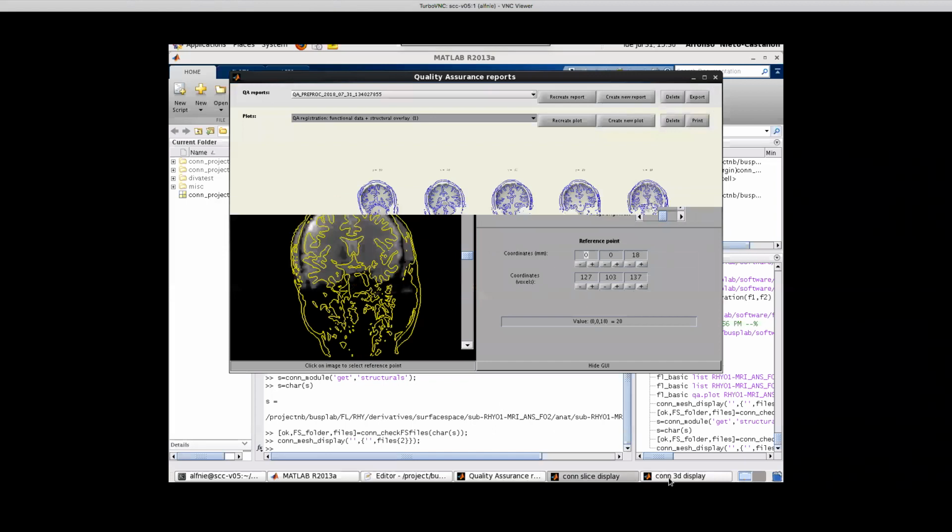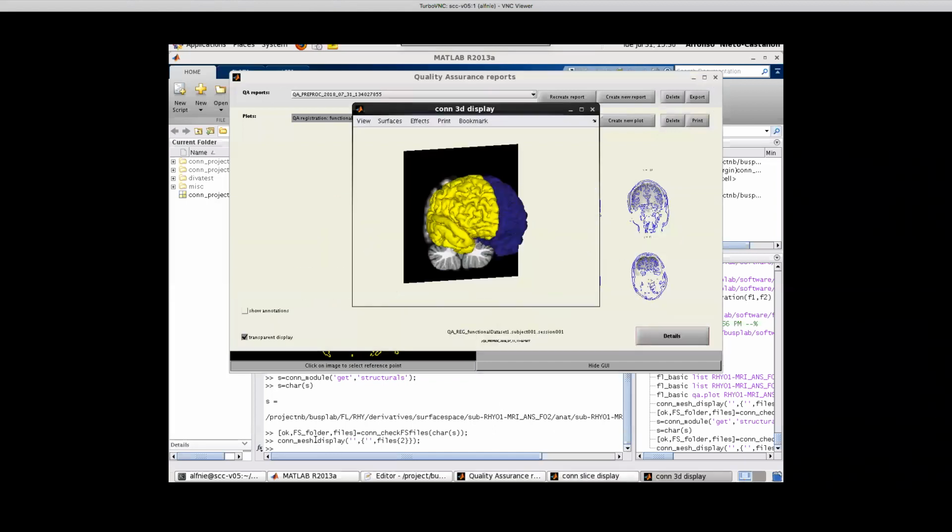And what I would suggest is instead of the pial surface, that you plot it on the white matter. The pial is like a semi-inflated surface. But the subject-specific ones? Right, the subject-specific one. Okay. Or do you have that? No, we don't have subject-specific. Oh, okay. Yeah, we only create white matter ones. White matter would work, or even the inflated would probably work. So for the subject, we have the white, pial and the sphere. And we could plot either functional data, curvature data, or I don't know. And we could add any type of reference slices if we think that is useful.